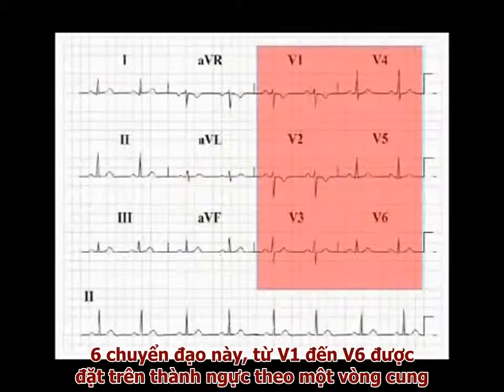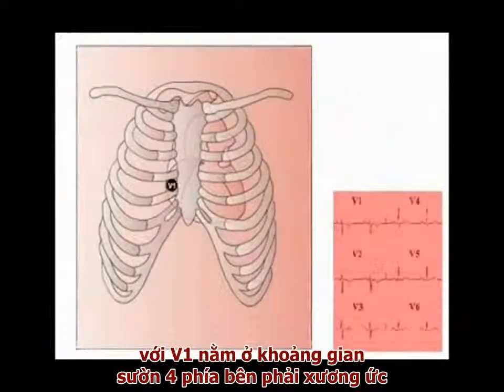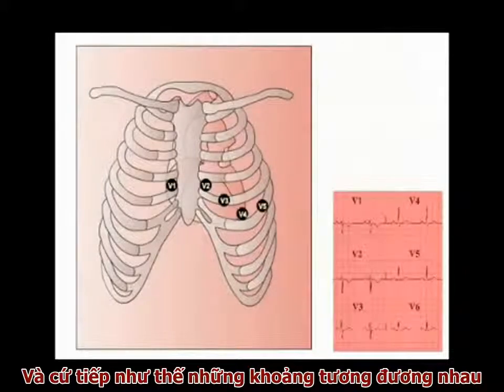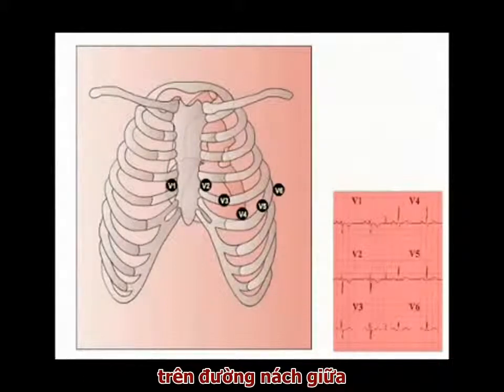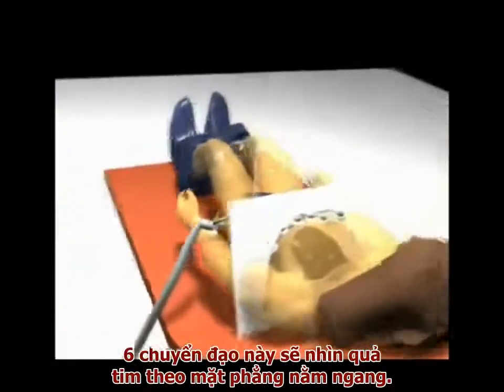These 6 leads, V1 to V6, are placed on the surface of the chest wall in an arc. From V1 in the fourth right intercostal space to the right of the sternum, to lead V2 in the fourth left intercostal space to the left of the sternum, and then at roughly equal intervals to lead V6 in the fifth left intercostal space in the mid-axillary line. These 6 chest leads examine the heart in the horizontal plane.